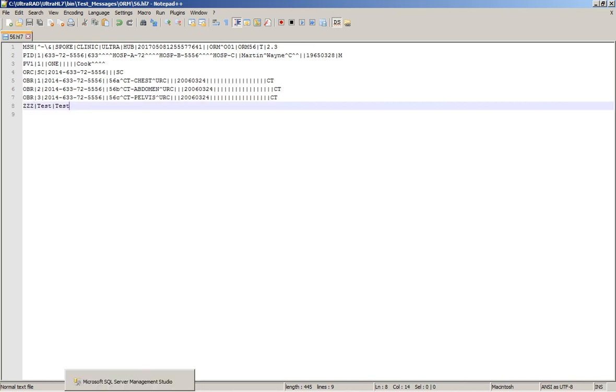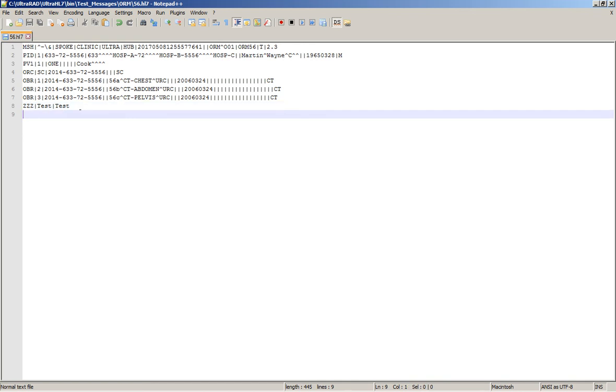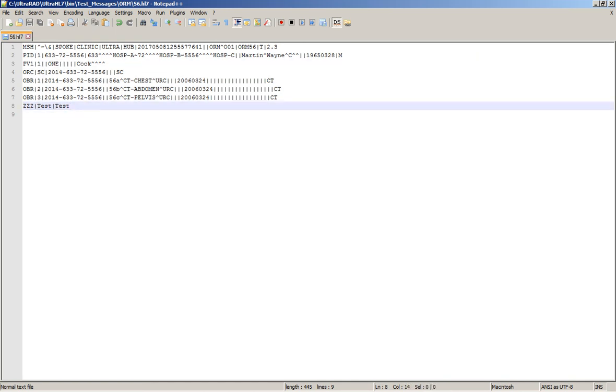So in the database, I don't actually have to change anything. When this message maps, it'll simply map 3 scheduled procedure steps for a single requested procedure, for a single visit, for a single patient. So when I reprocess this message, in total I'll see 9 orders. I'll see 3 versions of each of these orders for the 3 different types. And I can mix and match those to see them if I need to from, say, a modality. But let me show you how this is going to work.